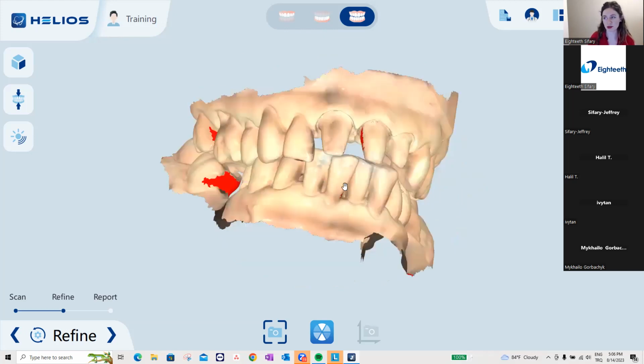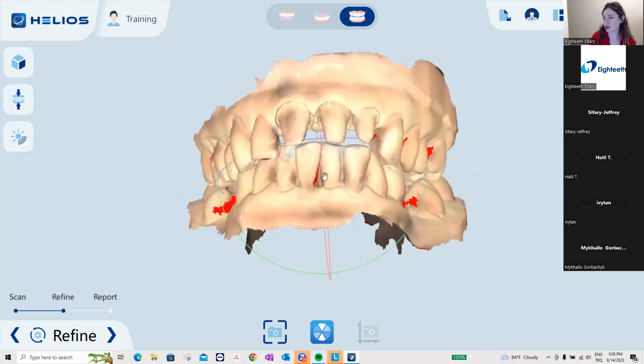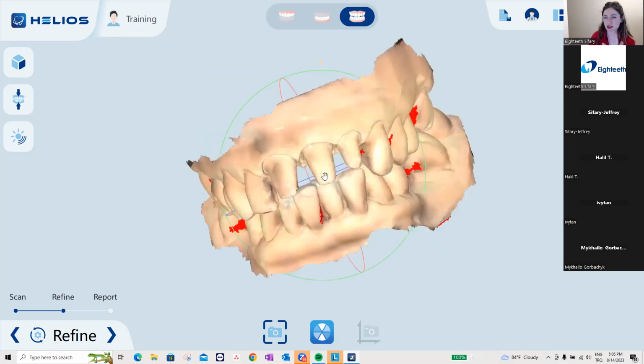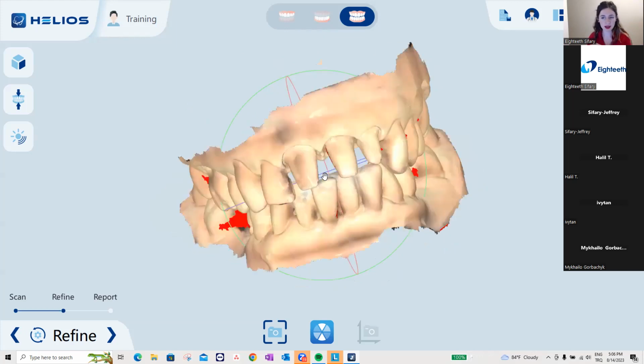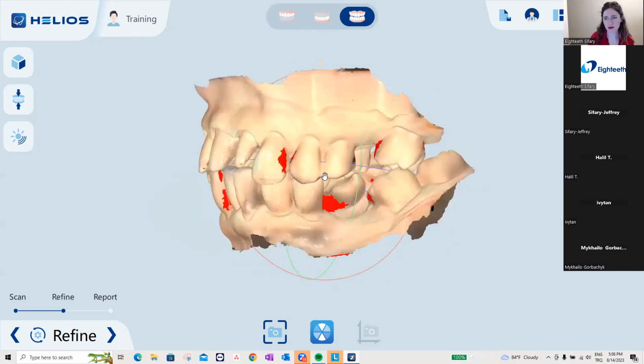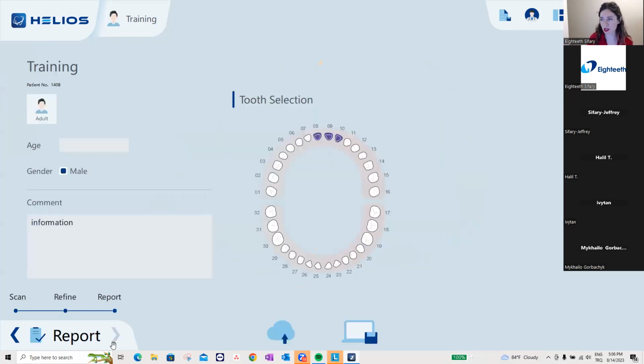It's available also, but if you don't need it, after checking it you can finalize. If I click the next arrow, I don't need to enter the patient name here. It's okay. So there are some tools selected.